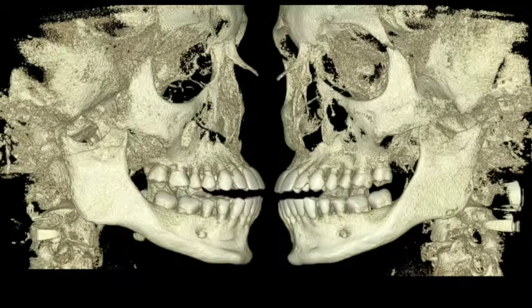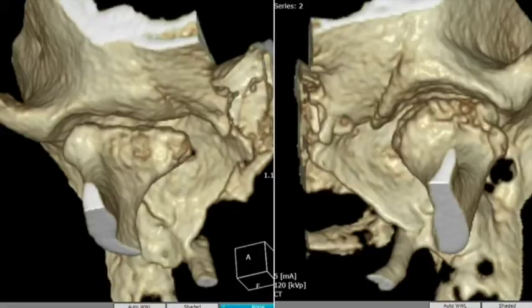This is the 3D condyles that I got out of that scan, and it's terrible. There's so much scatter, artifact, and I can't get rid of it. No matter how good my software is, I can't. And trust me, I can make sexy condyles, okay?